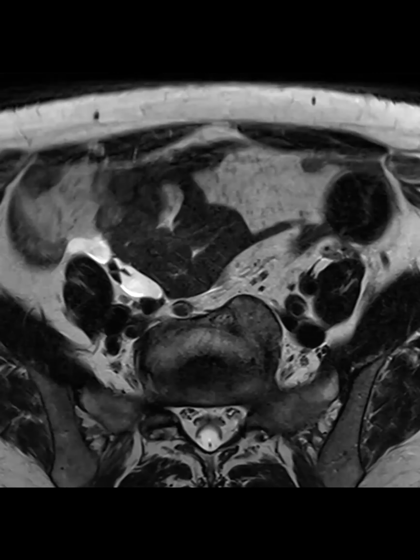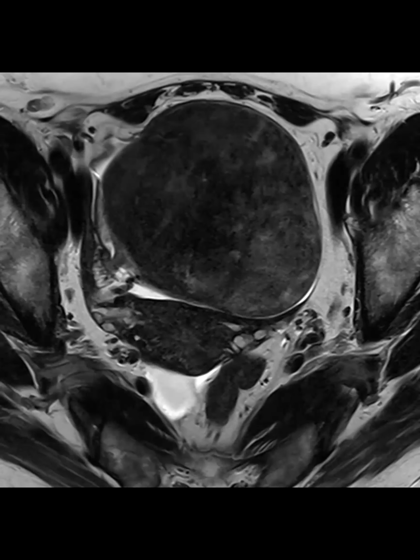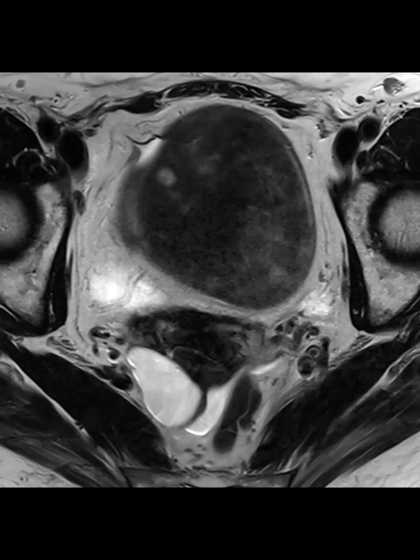This is the other thing that I wanted to discuss. This was an incidental finding, but where did the ovaries go? So this one I thought was coming from the right side, because you can see here, I think maybe, are the follicles. Oh, that's cool, I see a stalk, the gonadal vessels that are going to it right there.